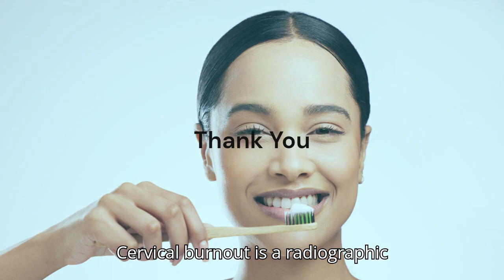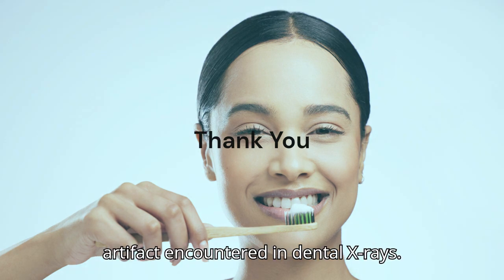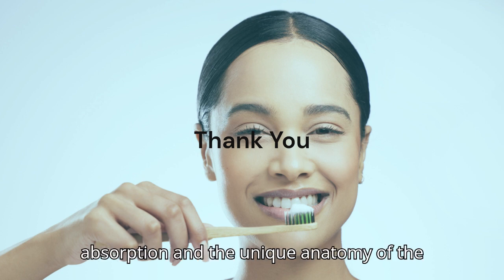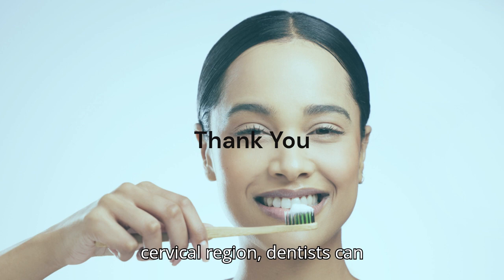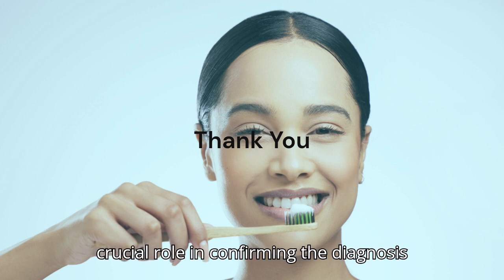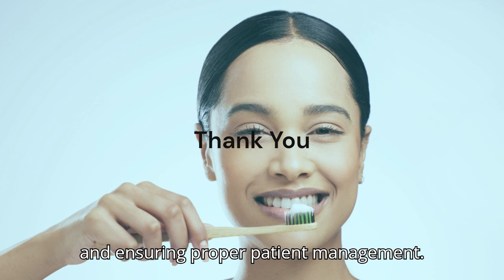Cervical burnout is a radiographic artifact encountered in dental X-rays. By understanding the principles of X-ray absorption and the unique anatomy of the cervical region, dentists can effectively differentiate cervical burnout from dental caries. A comprehensive dental examination plays a crucial role in confirming the diagnosis and ensuring proper patient management.